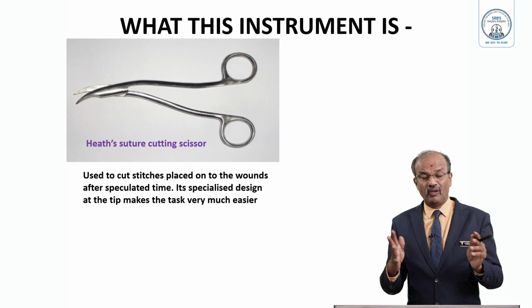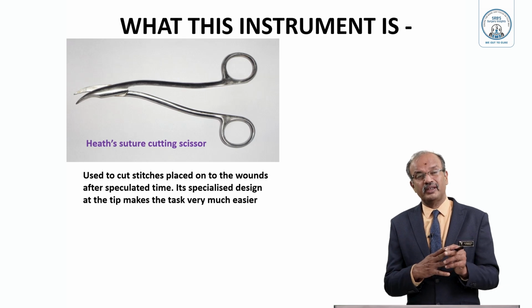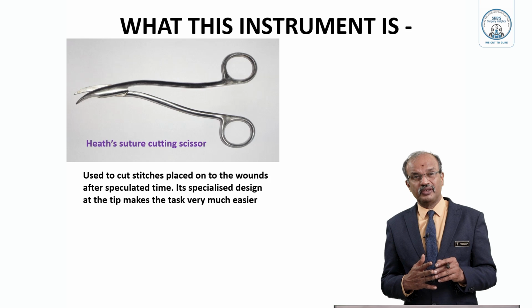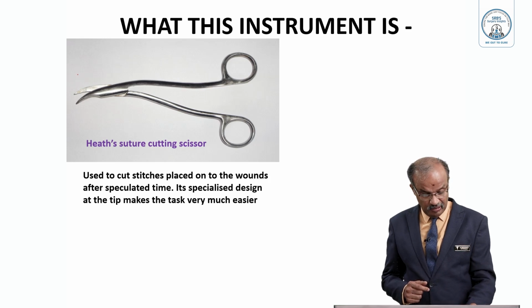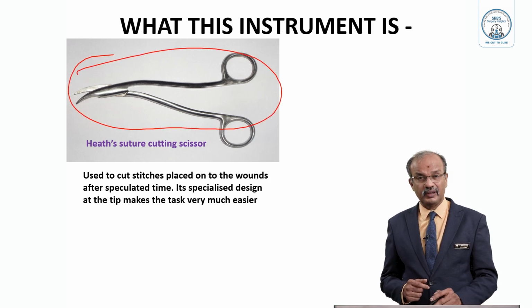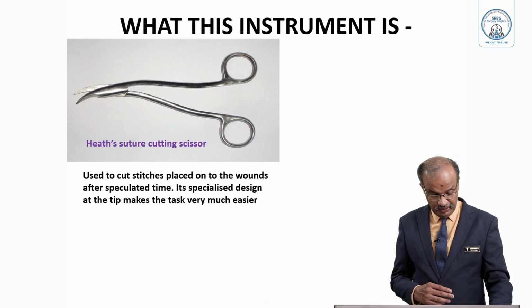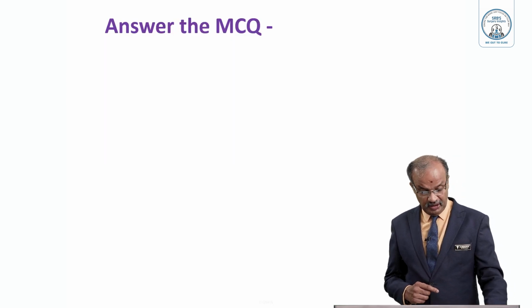Very useful in all wards, casualty, emergency places or daycare places. This instrument is usually used and is a very essential, useful instrument. Heath's suture cutting scissors. So answer the MCQ.